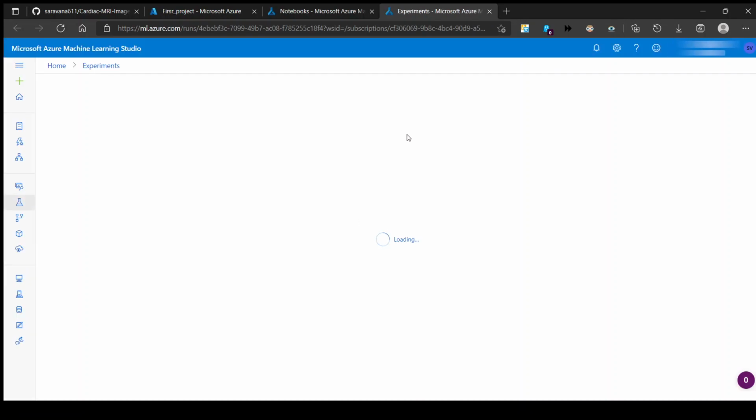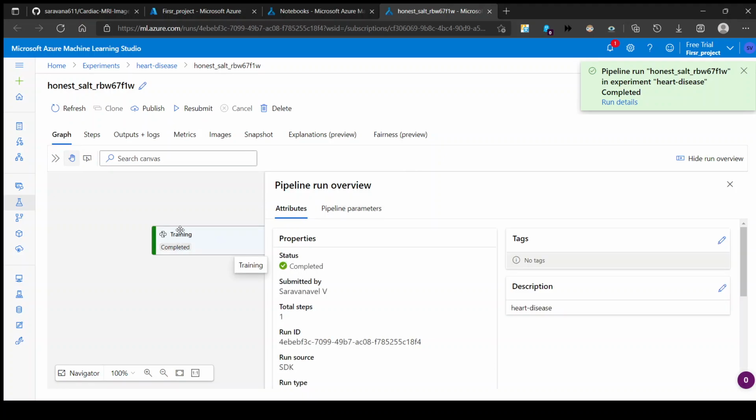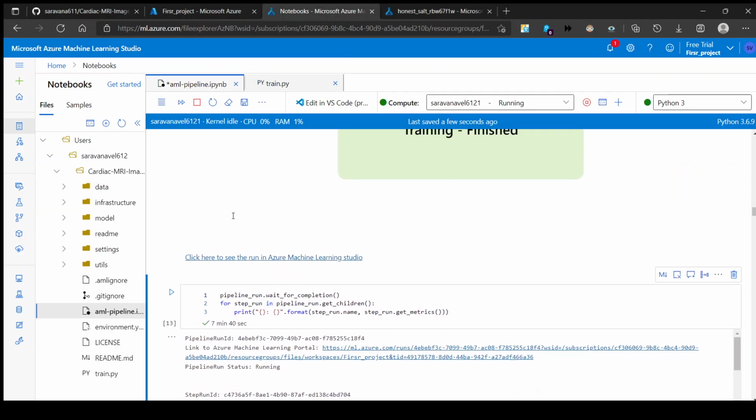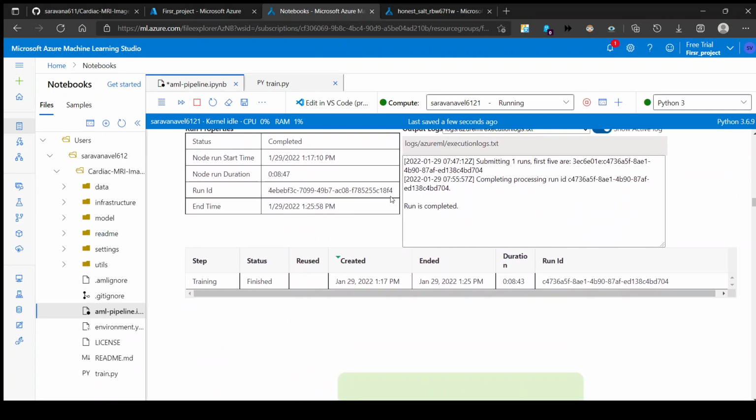the running status. So this is my deployment, and the run is shown here. So you can see the training of my machine learning model in the deployment server is done. If I train the model, it can directly show that. So you can see the training process is finished, and see my logs also. This is my logs, and the run is completed. The deployment status is completed.